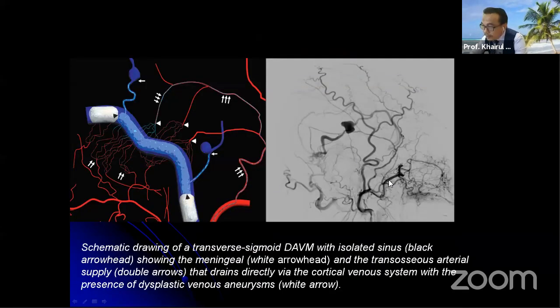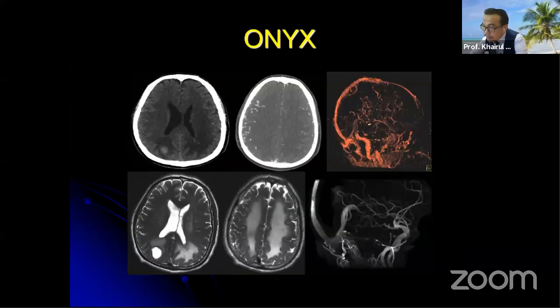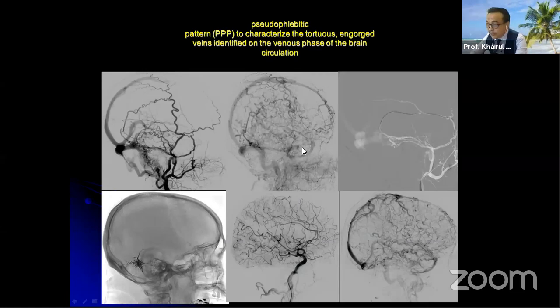The dural fistula is what we commonly treat, like in the transverse sinus, sigmoid, and superior sagittal sinus. This is how an untreated dural sinus fistula looks. They present with chronic venous hypertension and bleed, because it was undiagnosed before they were sent to our hospital. This is a very complex appearance.